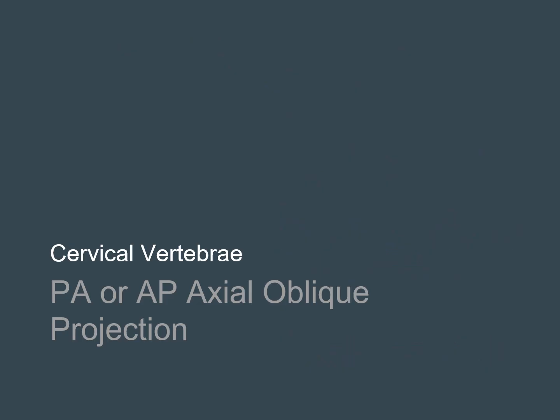Moving forward, let's talk about radiographic image analysis guidelines for a PA or the AP axial oblique cervical vertebra projection.